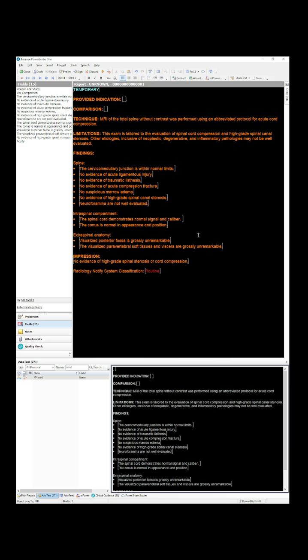Certainly when I'm working on this, I'll add things like multilevel degenerative changes produce up to mild spinal stenosis. I might delete this and say suggestion of mild nerve foraminal narrowing up to this, if I see it, and talk about the caveats, the nuance, et cetera.